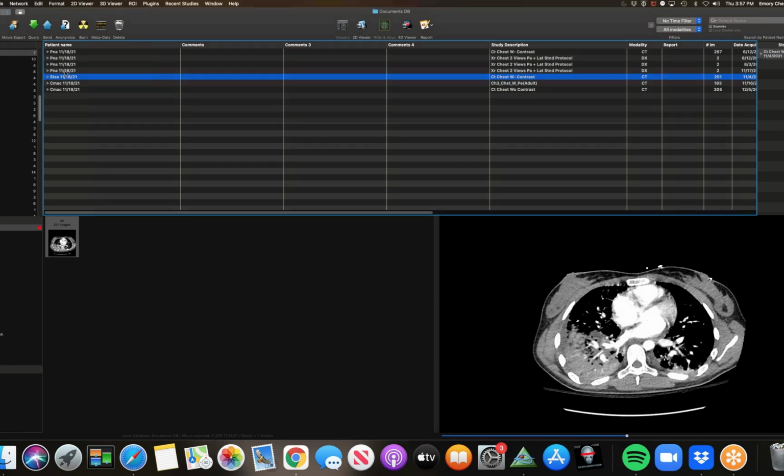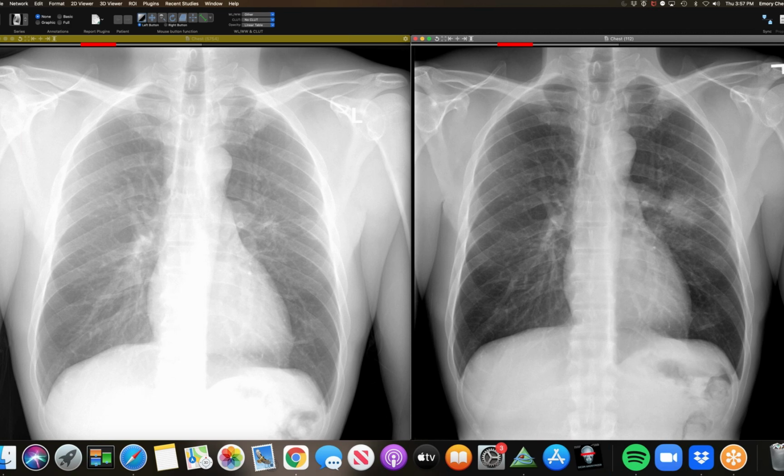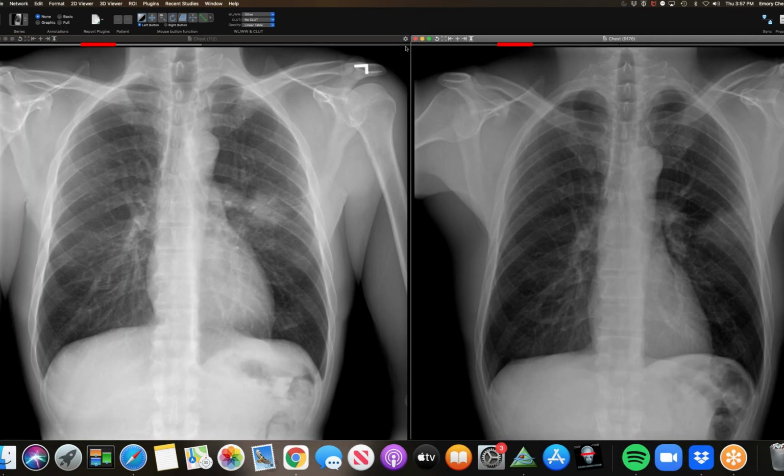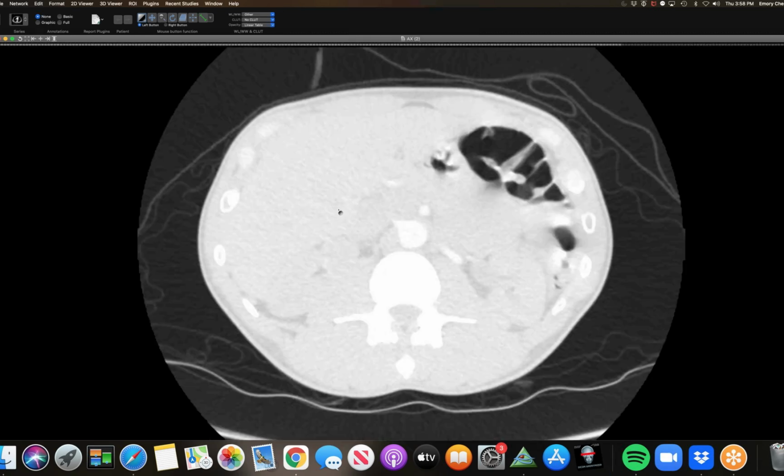And the last case I found interesting because I don't see these here very often. This is a 40-year-old patient, and this is his initial radiograph from June. He just came in with chest pain and some cough. He was admitted, started on vancomycin and Zosyn, but he also had a BAL, and here's a CT.